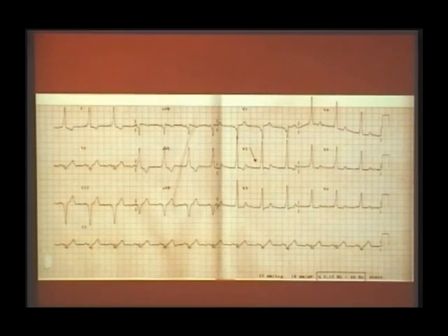So the first step is to diagnose a QRS widening. The second step is to see whether it is an initial delay or a terminal delay. If it is an initial delay, it is pre-excitation; if terminal delay, it is a bundle branch block. Look at this ECG here. The QRS is widened, isn't it? It's around 4 squares. But see that the initial portion is a little slurred, and the terminal portion is so sharp and narrow.